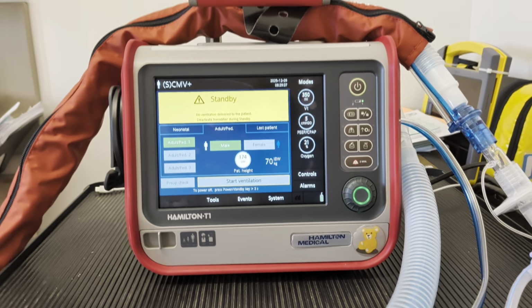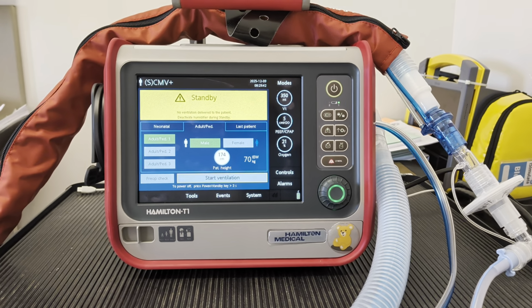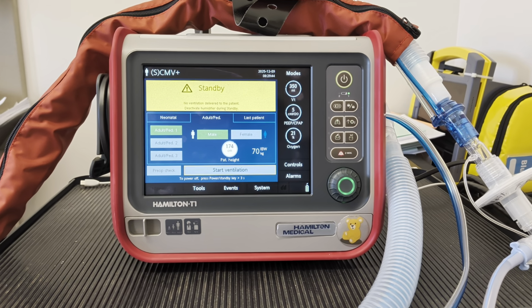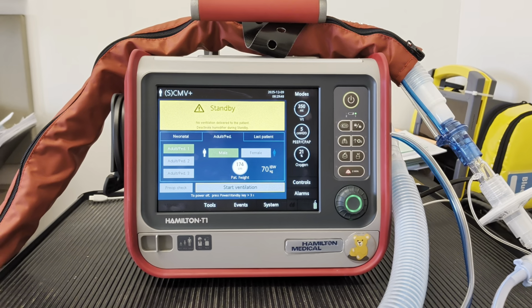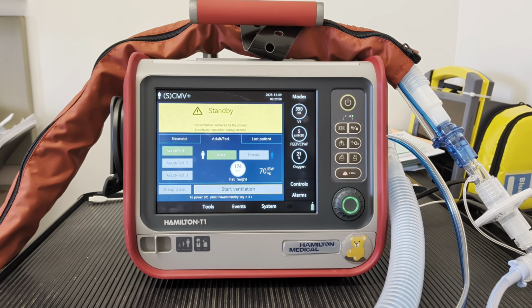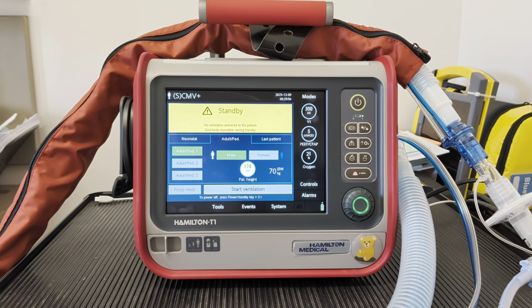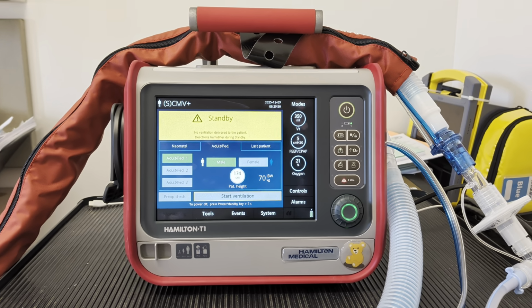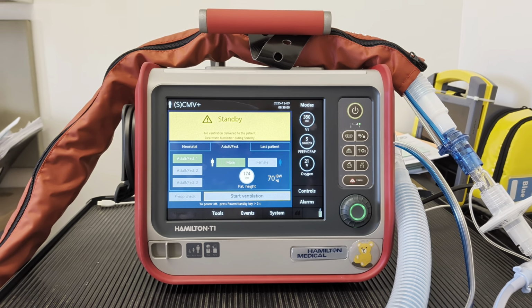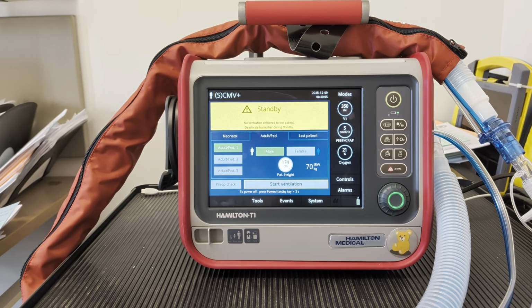In lungs where the airway resistance is very low and air can flow easily into and, of course, out of the pulmonary system, you're looking at an airway resistance of somewhere in the neighborhood of 10 centimeters of water per liter per second or less. So some people will say between 8 and 10. If you're less than about 10, your airway resistance is more or less normal.